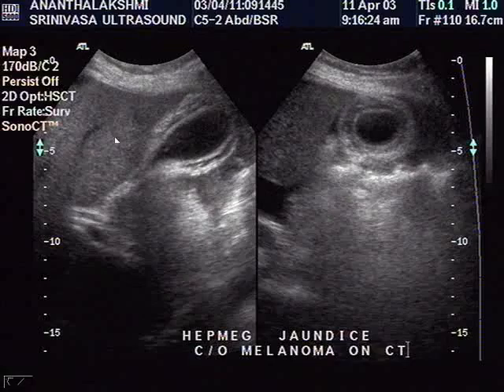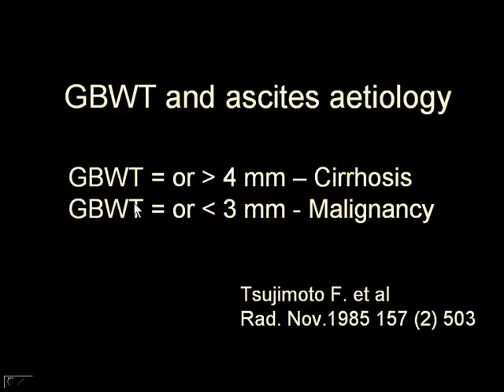Okay, now here is a hepatomegaly, jaundice. This is a case of melanoma on chemotherapy, and because of the hepatotoxicity, the gallbladder wall has thickened. So it could be due to hypoalbuminemia, which occurs.